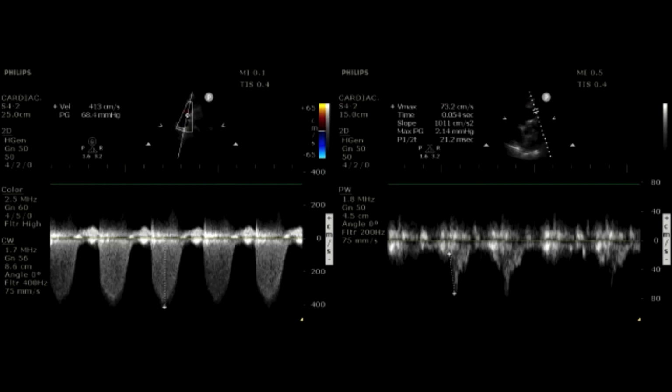For me, this is an understanding of the physiology, saying, okay, I have a large vascular area occlusion, and I'm seeing it show up physiologically on these parameters. So I should probably either be ready with therapy, or triage them to a higher level of admitted care. But should I be thinking about it differently? Should I be using it differently? How would you, as a cardiologist, interpret this data?